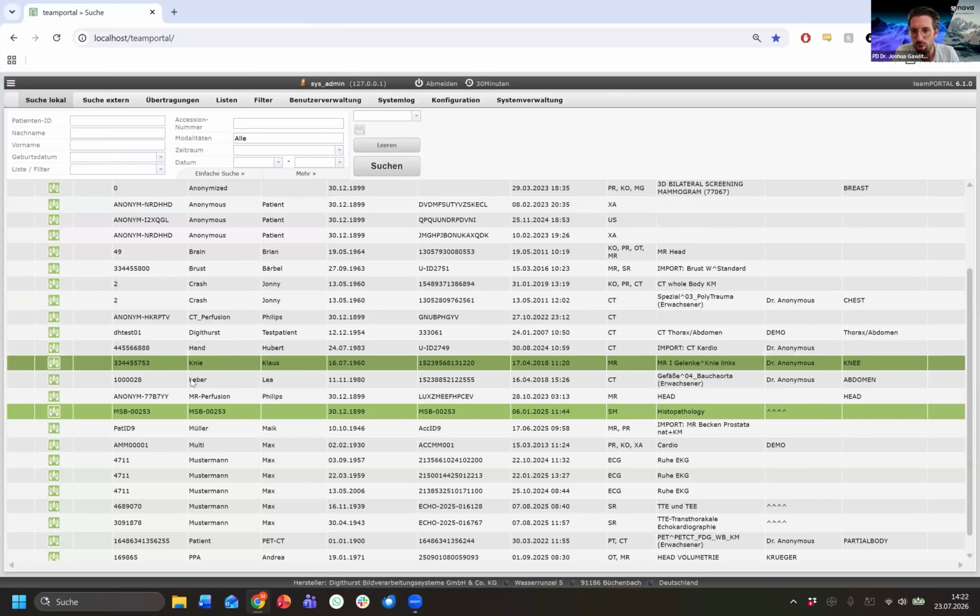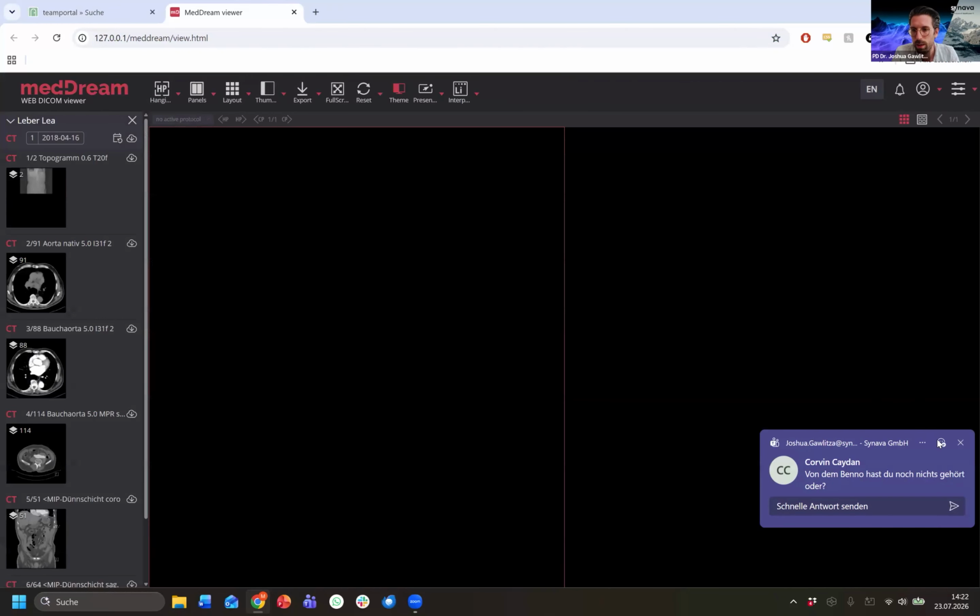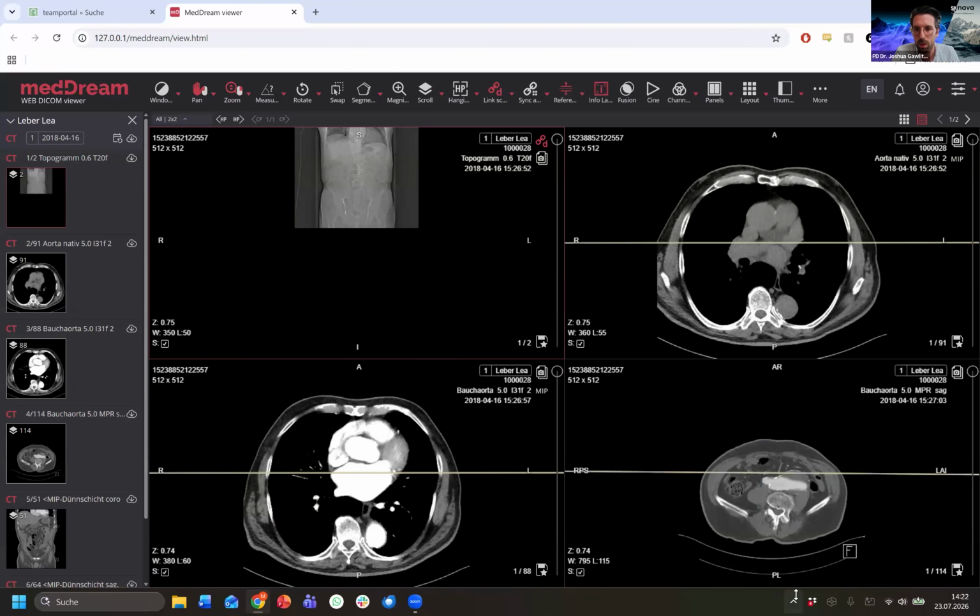And the next things I want to show you are a lot in the area of classical radiology that you can see here.